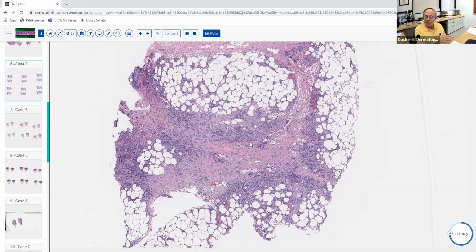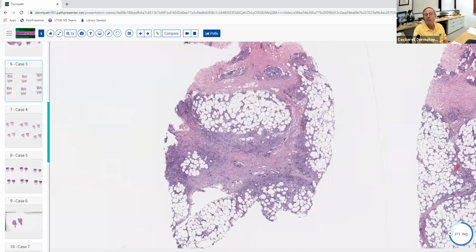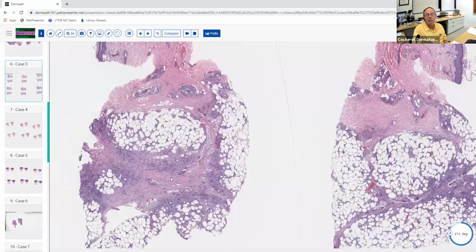And if you get it late, when you get a lesion that's almost resolved, then you may just get a little residual inflammation here, the septum still thickened, and a little bit of degenerated fat where it was present in the lobules out here. So they can be a little bit more challenging when you get a later lesion. So it's better to diagnose it when it's in a fully developed stage like this. And then you can really make a definitive diagnosis of this.